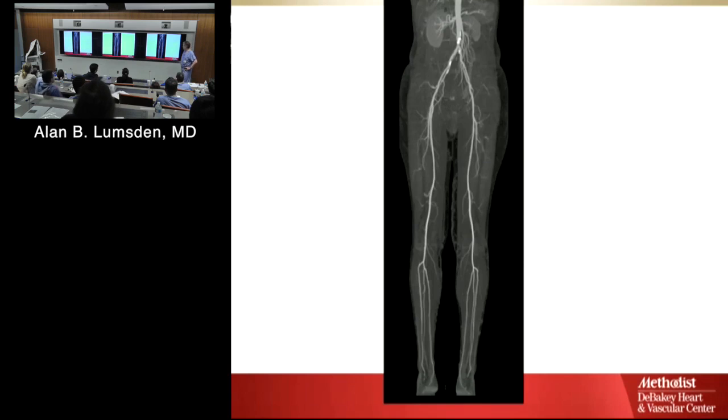Okay, no. This is a CT angiogram. It gives a pretty good picture of what's going on. All righty, so how would we use this? Patient in the office, they may have come in with bilateral buttock claudication. They've got a stenosis in the distal end of the aorta. That's something that we'd be able to treat. Now, you can't tell absolutely that there's a stenosis in this until you get different views.